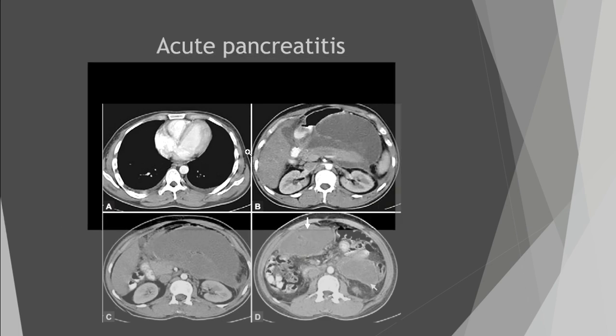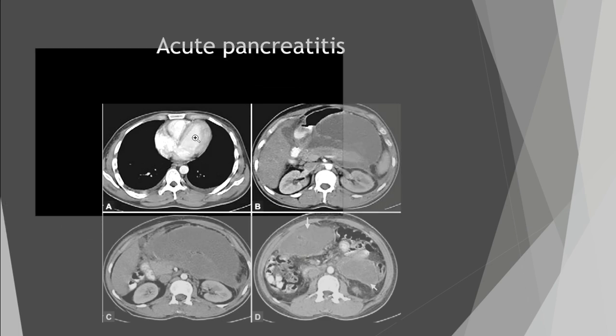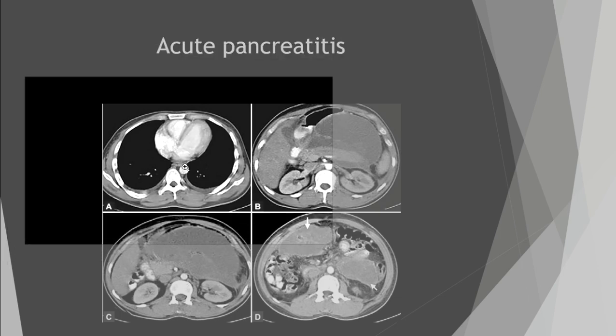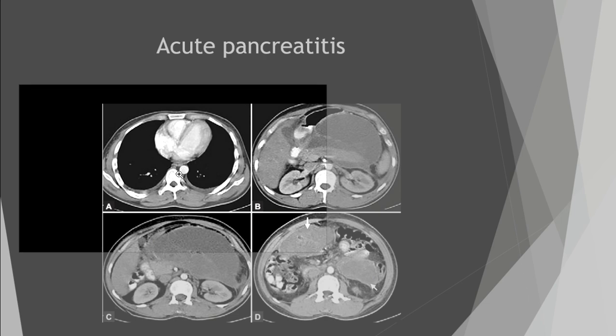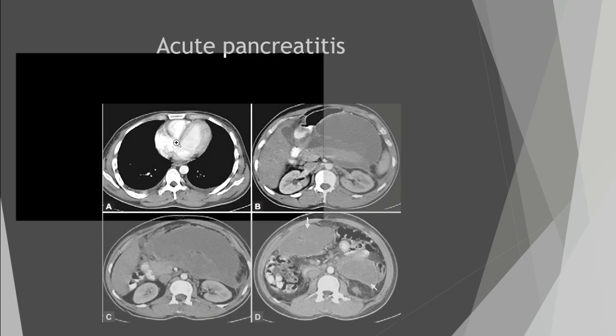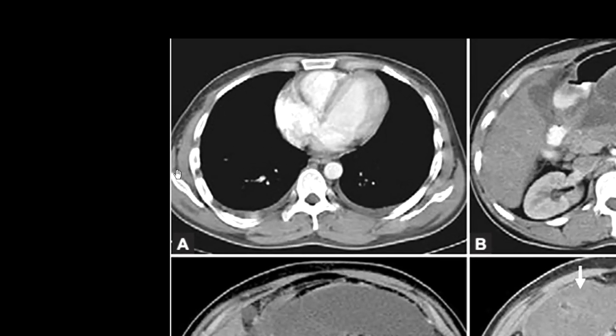We didn't see any pancreas here. We see the lungs, we see the heart, we see the aorta and parts of the esophagus. Why is it placed here? I'll show you.